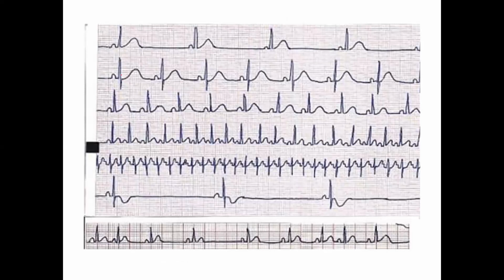And here are the ones from your book. So take a look at the beat and remember the heart rate. Assume that all of these are 6-second strips. So here are all your sinus rhythms, right? This is sinus rhythm, but what would you call this one at 40 beats per minute? Bradycardia. Right. Thanks, Danielle. Bradycardia.